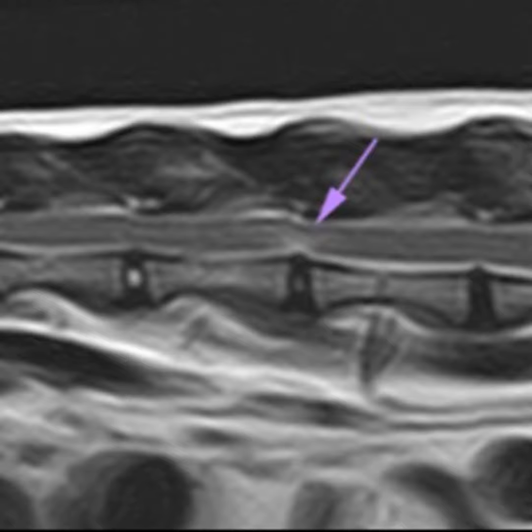But we base our criteria mainly on the extension of the intramedullary hyperintensity on T2. So you mean where it's centered? So the shorter intramedullary hyperintensity underlying the changed intervertebral disc is useful for us for a diagnosis of the acute non-compressive nucleus pulposus extrusion.